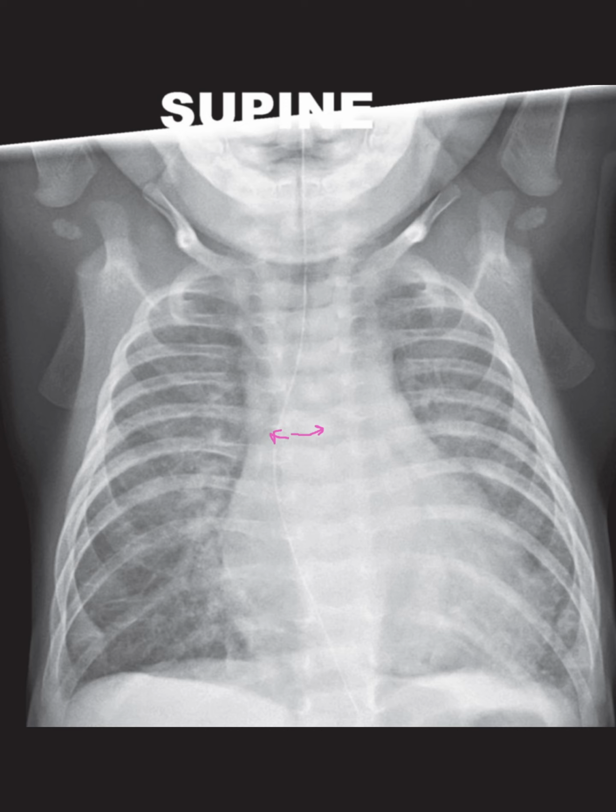Moving on to the diagnosis, we are seeing signs consistent with a 2-month-old girl who has mitral regurgitation and pulmonary hypertension. These findings are crucial because they point towards congenital heart disease, which includes a spectrum of conditions like tetralogy of Fallot and transposition of the great vessels. It's vital to be familiar with these, as well as with the corrective surgical procedures that might be identifiable on a chest radiograph. So how do we differentiate these conditions?